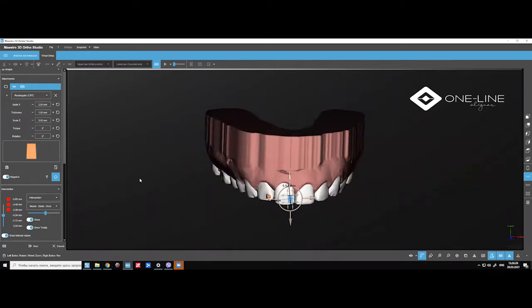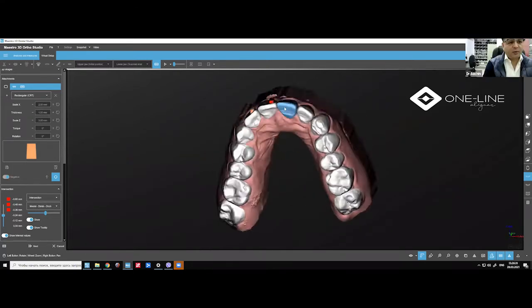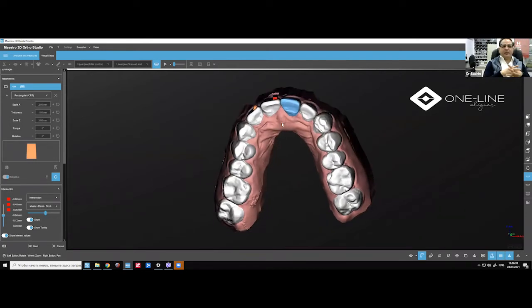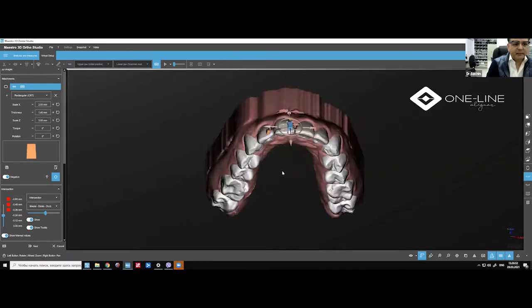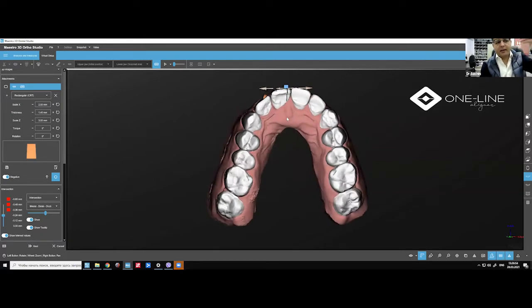So this is what you're going to have in the mouth: the depth which goes inside the tooth is 1.1, but in the aligner it is going to be like 0.2 or 0.3 only. It's a lot less. So sometimes you need to increase the thickness, so actually get a bigger one to get more depth inside the tooth.